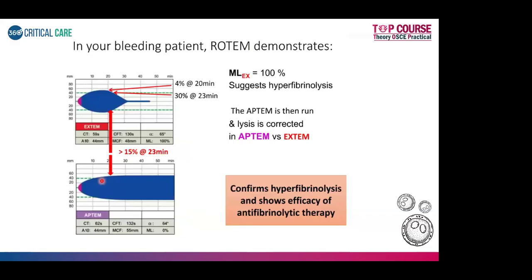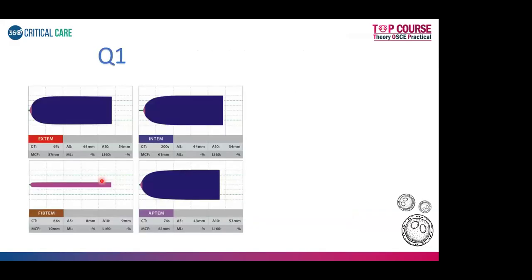Okay. So let us go to examples so that you will understand. Can anyone comment on this? If you have understood this, you can tell it clearly. What is the green line? What are pink and blue here?